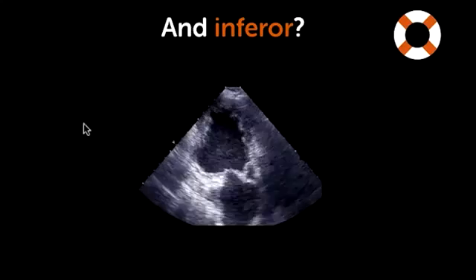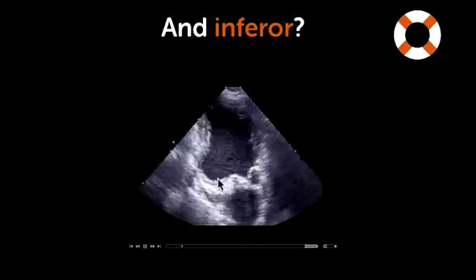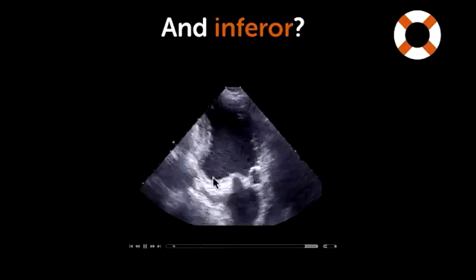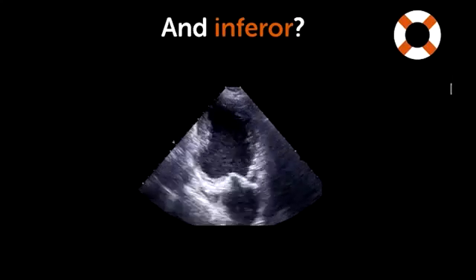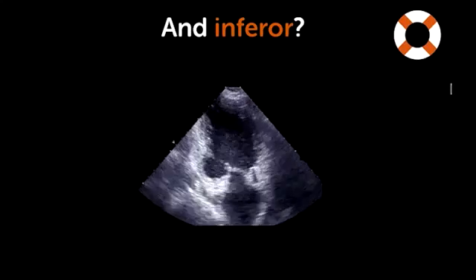Another infarct, but this time we can also see a dilated left ventricle and a distorted left ventricle with an aneurysm. This part bulges out, is thin, and does not move. We would describe this as an inferior aneurysm, which is less common than aneurysms of the apical wall, by the way.